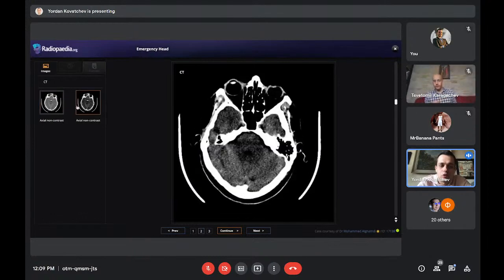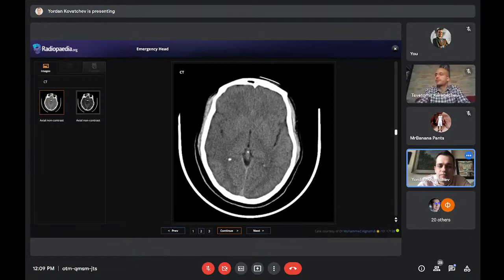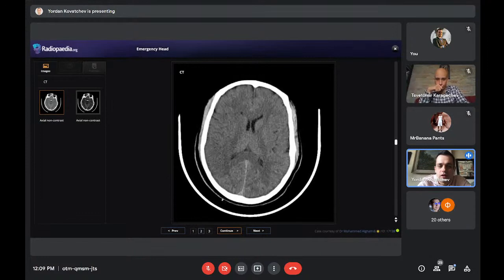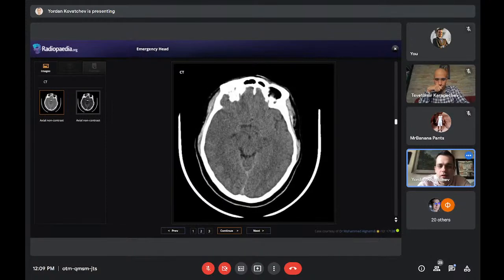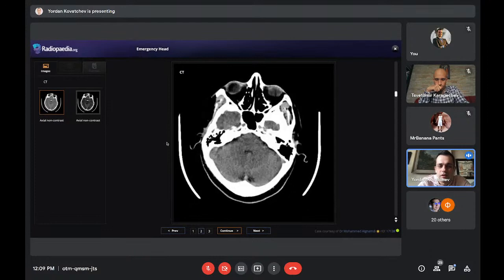And this is the stroke window, because if you look at this CT, I'm not entirely sure that I see a change in the basal ganglia. I go up, maybe here, yes, in this part. But I'm not entirely sure. Maybe hyperdense MCA, but then I window it.